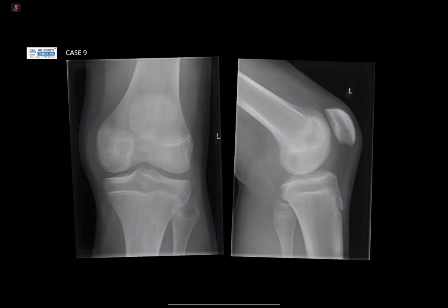The most worrying for me is in the medial condyle of the femur. There is a rounded lucent lesion in the femoral medial condyle with a thin sclerotic margin. It is well defined. I see some soft tissue swelling. However, I don't see any evidence of effusion in the joint space.